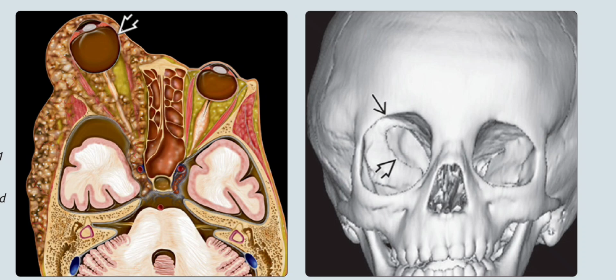So let's start with the imaging descriptions of neurofibromatosis cases. So the left is the axial graphic, and it shows the enlarged right middle cranial fossa, dysplastic sphenoid wing, and a large orbital periorbital plexiform neurofibroma. Note the exophthalmos and the buphthalmos of the involved globe.